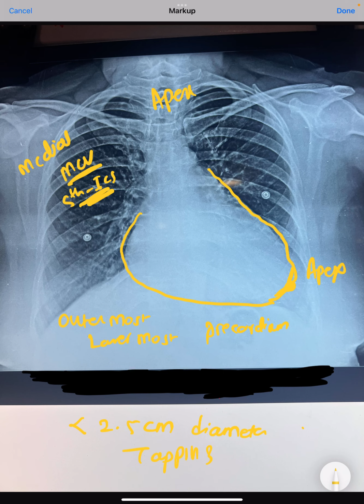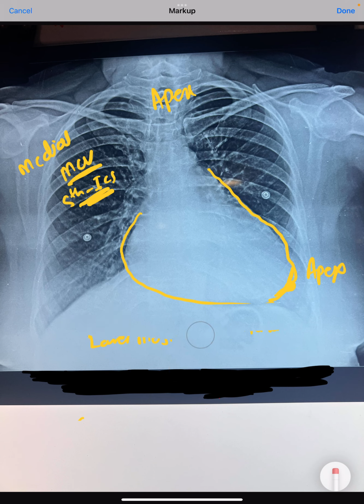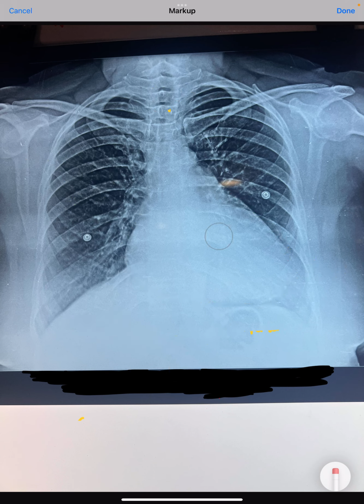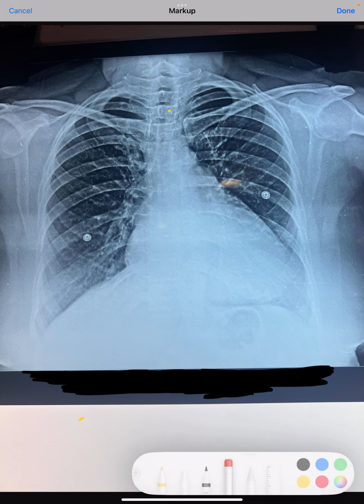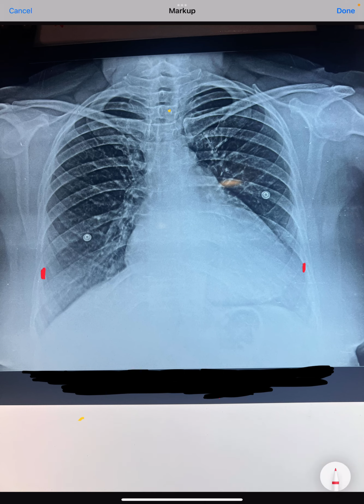Now here, as I have told earlier also, just by seeing we can see that there is apparent cardiomegaly, meaning the heart shadow looks very much enlarged. When do we say that the patient has cardiomegaly? We simply take the inner rib diameter, which is this much, and we take the cardiac shadow diameter, from where you have maximum distance calculated from the midline.